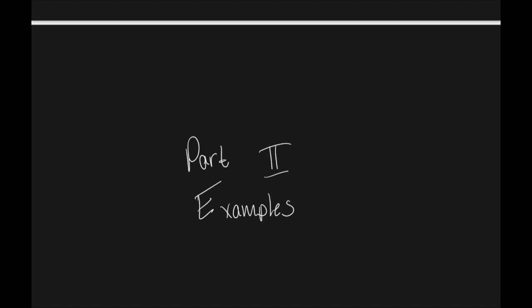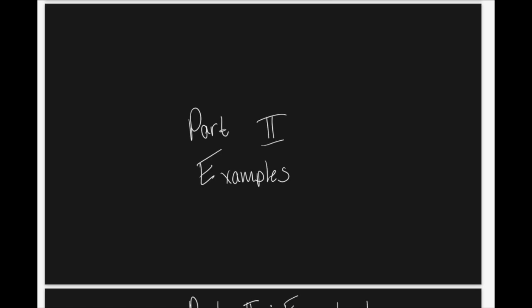But I think it would be a good idea to pause, go back over the notes, and gain some familiarity with these concepts prior to looking at these examples. Because for these examples, especially after the last 5, I would like to see you take charge and tell me what's wrong with the 12 leads. So, if we're ready, let's move on to the examples. Alright, let's move on to the first example.